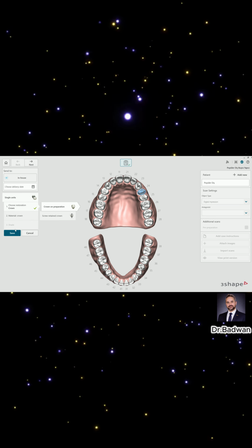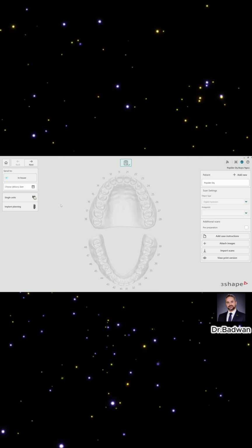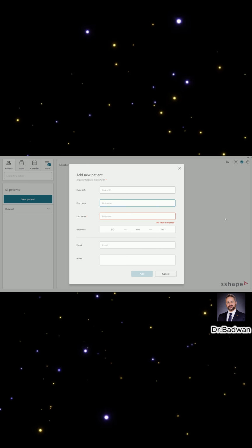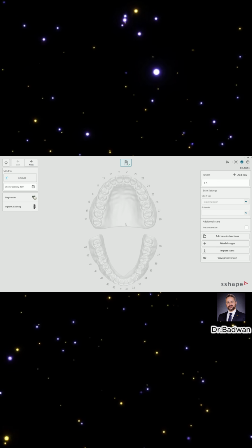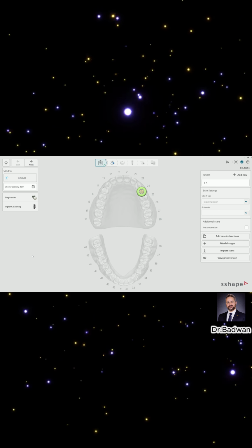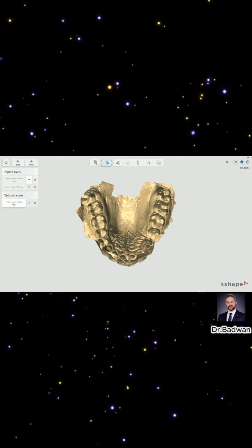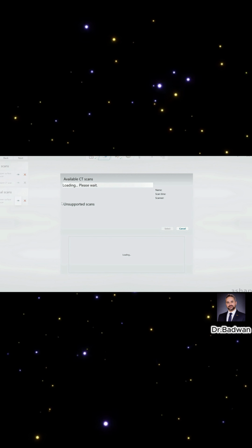I'm Dr. Badwan and today I will show you how to plan a single implant at site 24, starting from the final result. As you know, in implantology, the biggest mistake is not where you place the implant. It's where you don't design the crown first.